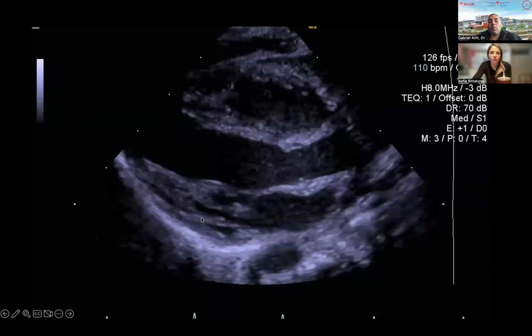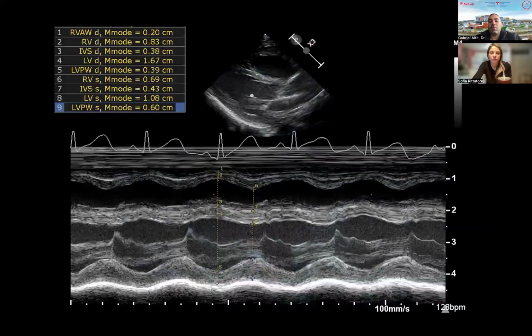They don't even use M mode anymore because of the angle dependency of M mode. But here's an example where you would see your LV, you have your aorta, your ascending aorta, your LA and your descending aorta. If you have this view, then you could technically use it. Ideally, you want to be angulated where you see some of the body of your RV, which is here, and you see your internal diameter both in diastole and systole, so at the QRS and at the peak of contraction.